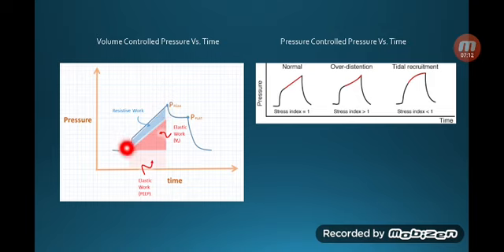So the ventilator pushes against resistance to open the lung, and then keeps a static pressure to keep the volume in for the rest of the inspiration period, and then releases and everything goes out. That peak there, the overshooting peak, is called the pressure peak, as you would expect. And then this bit here is called the pressure plateau.